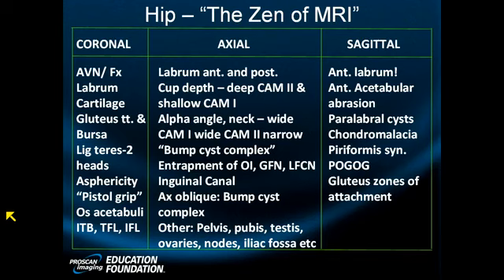There's an ischial and a pubic head. We're also going to show you some of the recesses around the hip, and the recesses are a little more prominent up high than they are down low. I think these are better demonstrated on imaging.